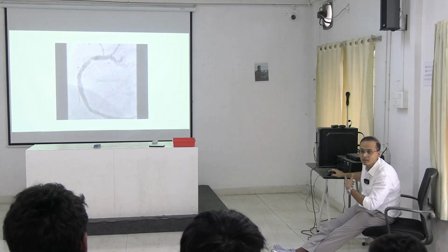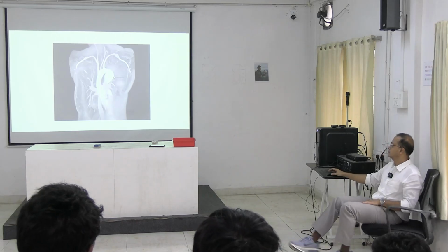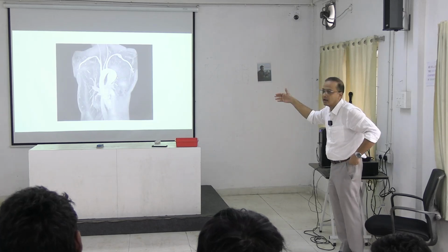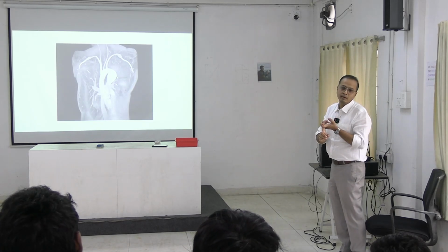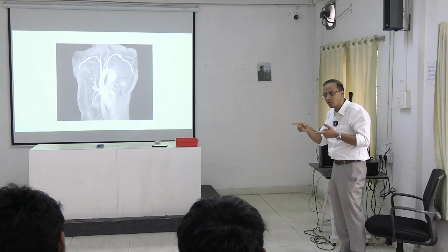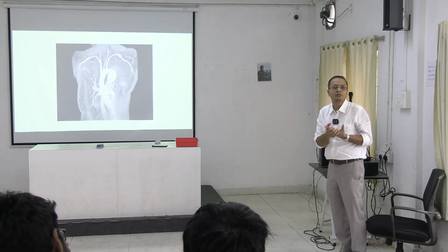So what kind of X-ray is this? Plain X-ray? It's a special X-ray. Clear? See that? So everything is visible. Then there is CT angiogram. So you are taking a CT scan or MRI along with the dyes. It could be CT scan with angiogram, or CT scan with bronchogram. So we call them CT angiogram, CT bronchogram, MR bronchogram, MR angiogram, based on what kind of visualization you are doing.